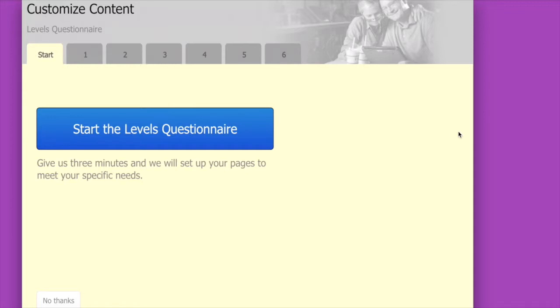If the professional decides to do the questionnaire, it will help you find the best vocabulary set or version of the application to use with a specific individual. It's short, it's sweet, you answer the questions, and it will help you match the program to the individual.